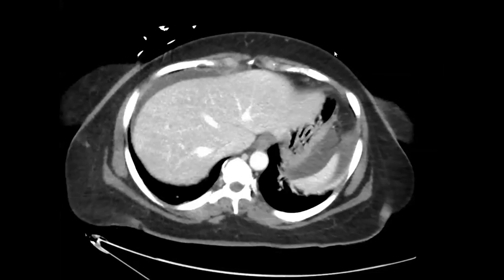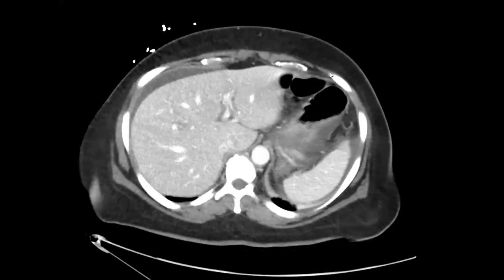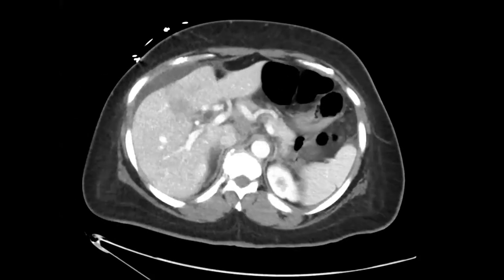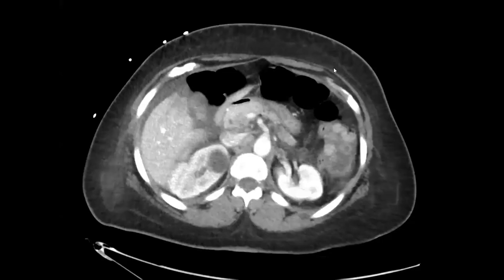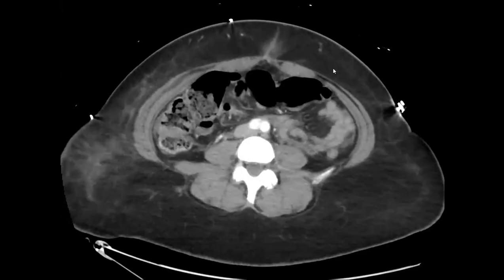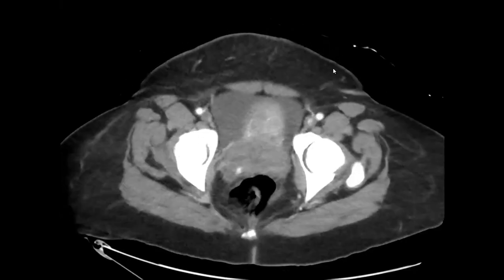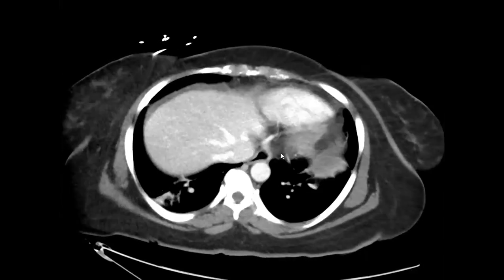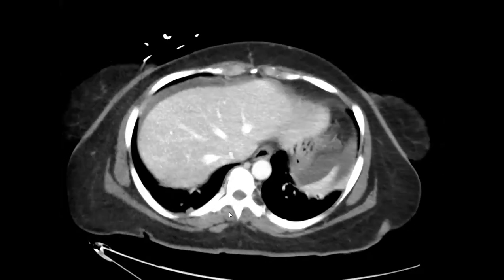So this person had an aborted cholecystectomy because they said that the gallbladder was heavily calcified and kind of tethered to the liver. And so then this is their post-op imaging. That aborted cholecystectomy was at an outside hospital. And you start back at the top. Oh yeah, incidental PE, by the way. Hopefully your AI doc picked it up.